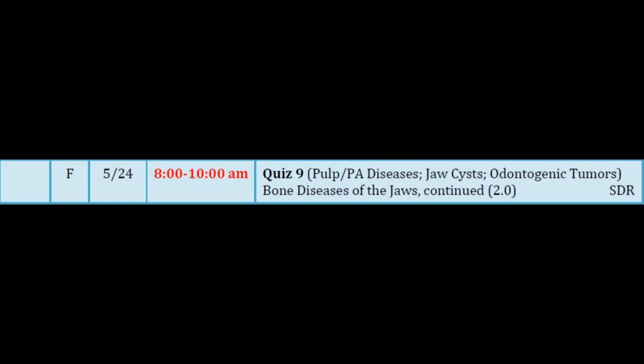Last question. Will that still be considered a bone scar? No. Bone scar is residual condensing osteitis. Sometimes we use the term residual osteosclerosis for residual idiopathic osteosclerosis after a tooth is extracted, but this is always cemento-osseous dysplasia. It doesn't matter. We don't change the diagnosis because you've lost teeth. Not called a bone scar.